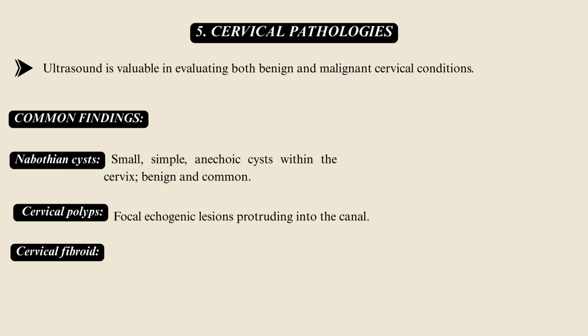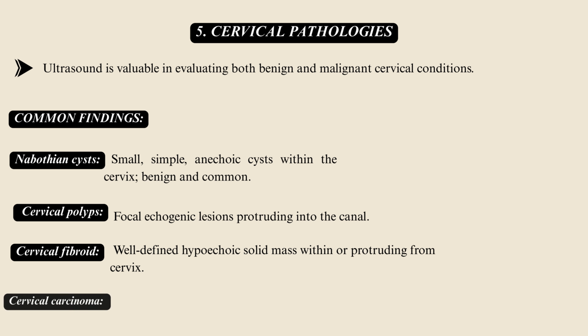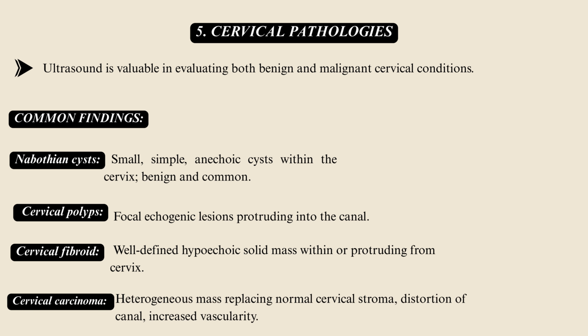Then is cervical fibroid, which is a well-defined hypoechoic solid mass within or protruding from the cervix. Cervical carcinoma, heterogeneous mass replacing normal cervical stroma, distortion of canal, and increased vascularity.